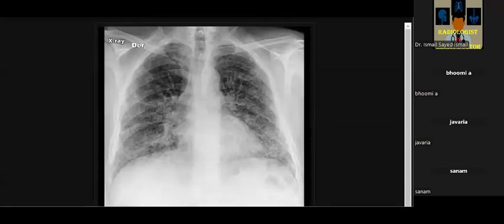I'm provided with the frontal chest radiograph of a skeletally mature patient. I can see there is reduced lung volumes on both sides. Multiple reticular opacities are seen in both lungs with more zonal distribution in the mid and lower zones. I can also see some nodularity along the right horizontal fissure.